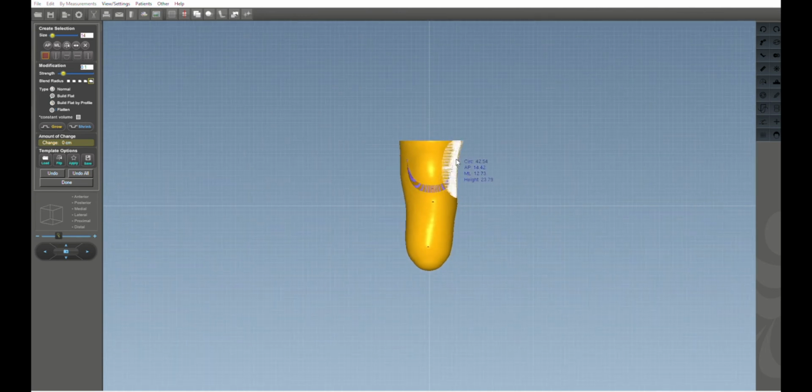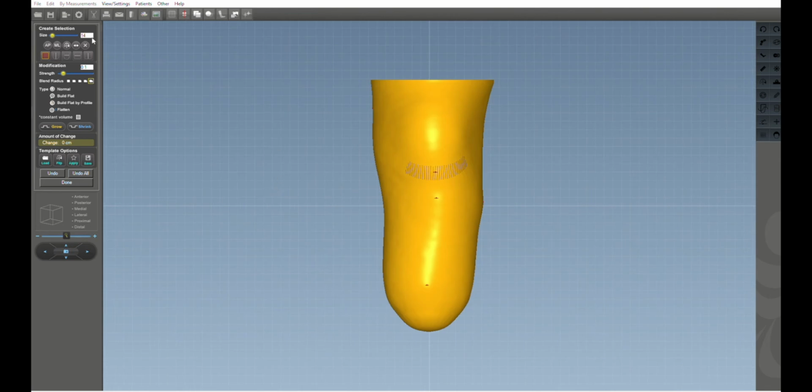Two fingers touching the mouse pad at the same time, so we've got a little bit of zooming going on. Let's just redo that with the distraction we had there. Control key. 1, 2. Wide there, good. Okay, and I like the 5mm bar, so 5. Remove that. Okay, now tibial crest.